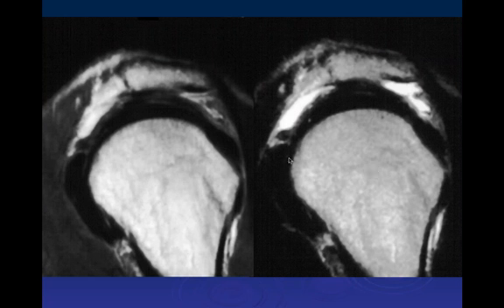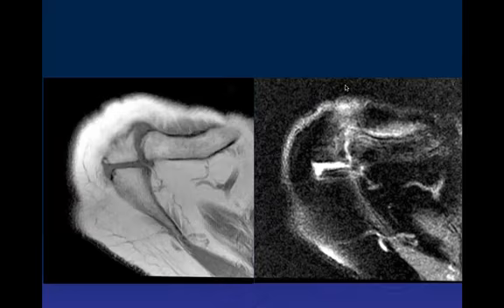We can see that the rotator cuff is intact here, but he's got a lot of subacromial subdeltoid bursitis here, and we can see this is all osteophyte here. The normal contour of the cortex of the acromion inferior cortex should go right along here. He's developed, from the wear and tear over the years, hypertrophic bone formation here, which has led to impingement, which was getting to the point where he really couldn't use his shoulder, and he certainly couldn't play handball anymore.